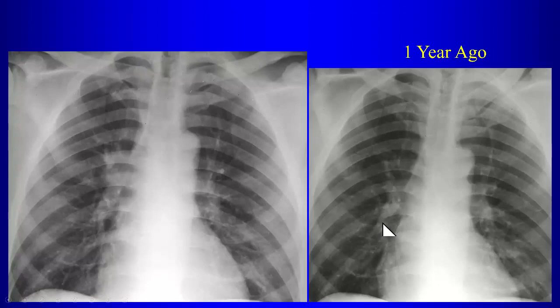So often, when you're reading a portable chest X-ray, you might have an X-ray that was done 3 hours later or 6 hours later.